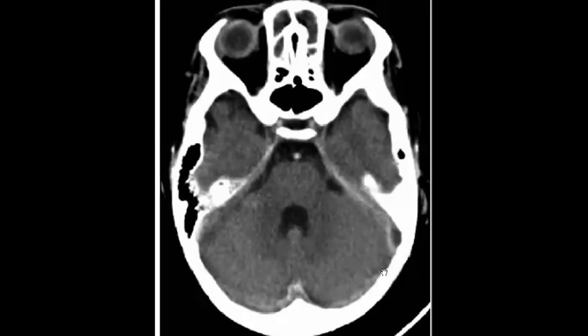So it can be thrombosed sigmoid sinus. Perfect. Perfect. You will then search for the cause, that maybe it is mastoiditis here that caused this sigmoid venous sinus thrombosis. Okay. So we have two, Ala Muhammad and Ala. Okay. Maybe nice. So at least we have this sign. Okay. So now try to collect with me. We have something in the left temporal, and we have this.